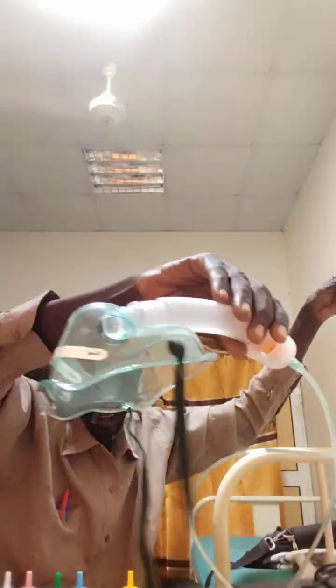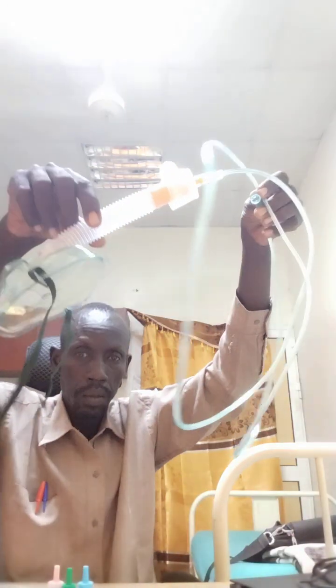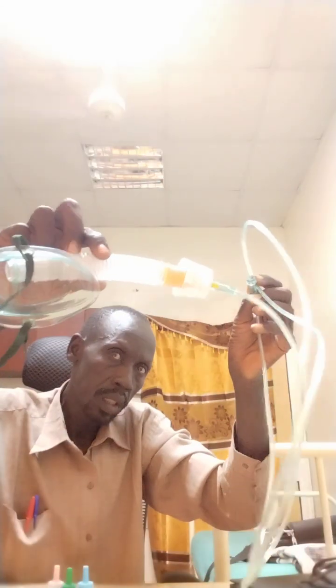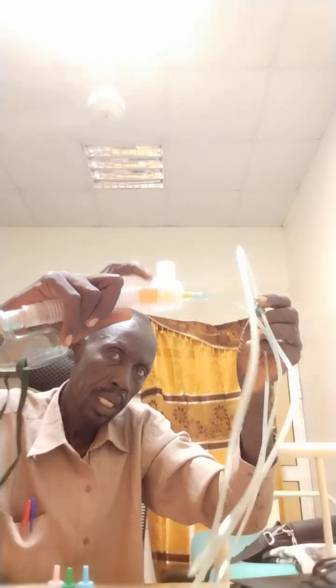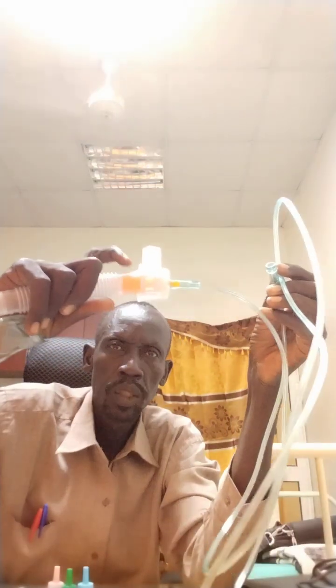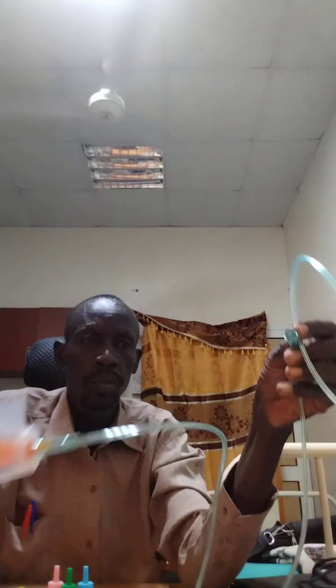You have this patient side, and this will be to the oxygen source, right? Now it is ready. And this one is going to give your patient, according to this color, using Venturi effect, an FiO2 of 50%.